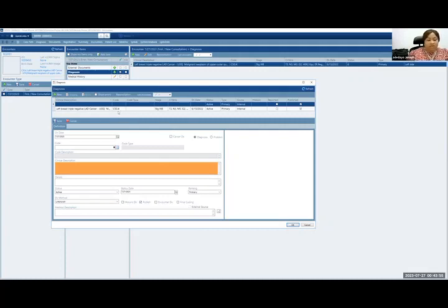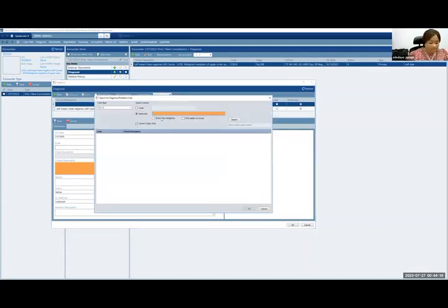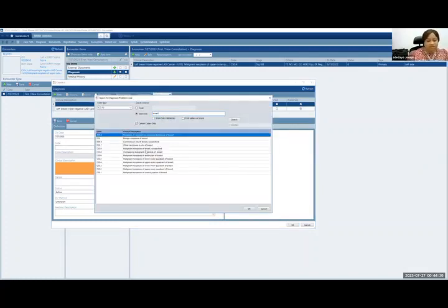The first thing I'm going to do is I'm not going to edit this old stage because this is what she was at presentation. If I edit it and change it, I'm basically erasing her history. And that's not what we want to do. We want to be able to see how she progressed through time or through the treatment course. So I have to start again and say she's got breast cancer. All right. And we remember that it was upper outer quadrant of the breast.